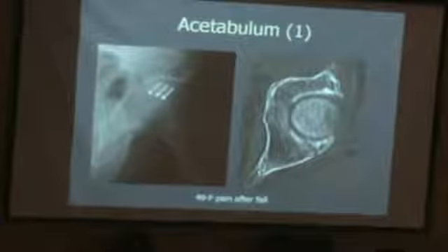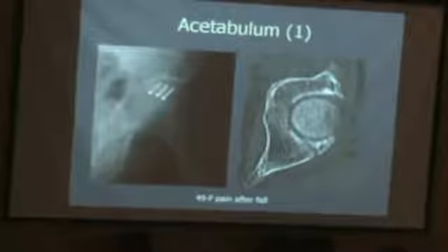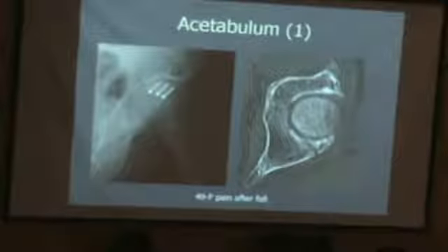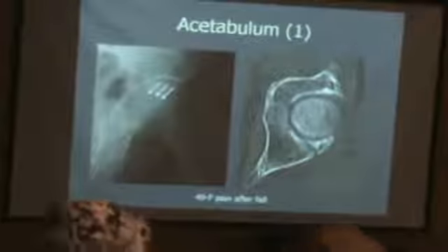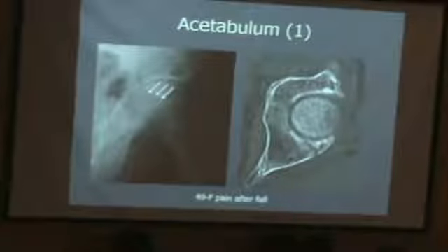49-year-old female, pain after fall, and quite honestly, I see the fracture, of course, here without any problem. We overlooked it because the patient has so many things as well. He has trauma to the lung. He has multiple fractures of the ribs. He has a spleen fracture. So essentially, we have so many things in the patient that the resident overlooked the fracture at night. The next day, when we look at the CT scan, we see very well the fracture, posterior fracture of the acetabulum.